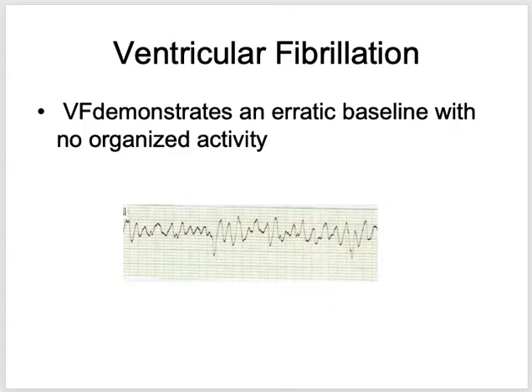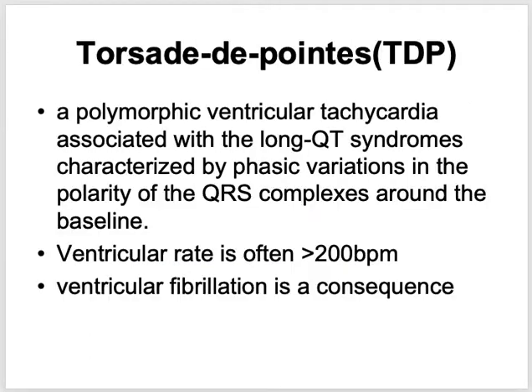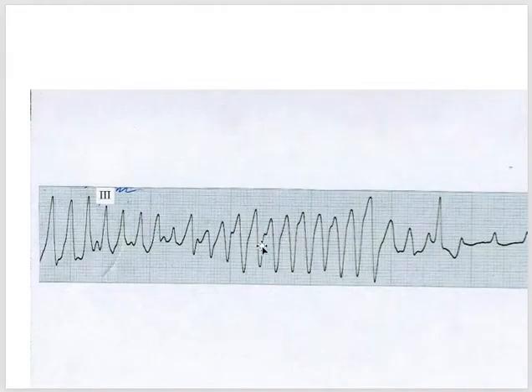Okay, so now you can see over here, there is something called torsades de pointes. Now, how do we catch on the ECG that someone has torsades de pointes? The ECG looks somewhat like this. You can see that there is big and then small and then again big, then again small.